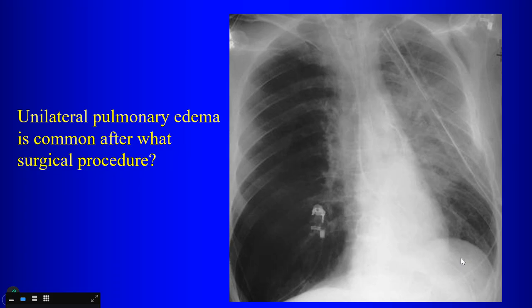So this patient received a lung transplant for what underlying disease? What's wrong with this lung? Yeah, emphysema. So this patient received a lung transplant for emphysema. So it's common to develop reperfusion pulmonary edema in a transplanted lung.